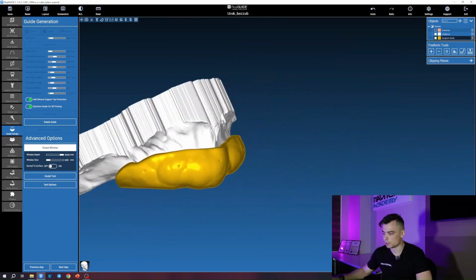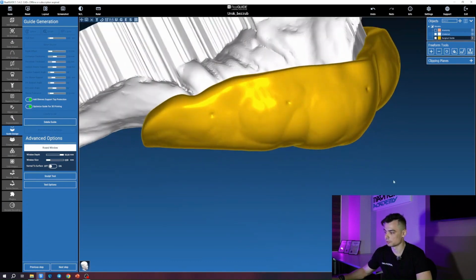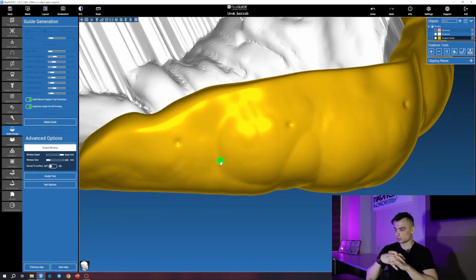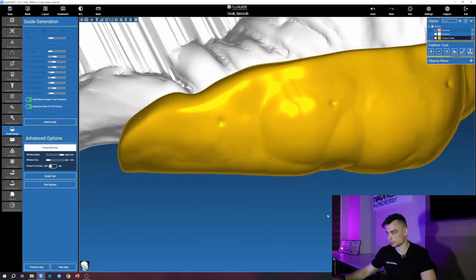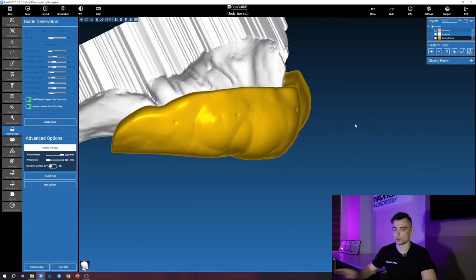So what happens if you don't position these areas where you're placing these markers perpendicularly? The thing is, this green slider, this green marking of the window, so to speak, it actually shoots through everything you see. Accordingly, if you don't change the orientation of your template in the 3D scene like I was just doing here, here, and here, but instead always create these windows from the same side, then all of them will be oriented in the same direction.